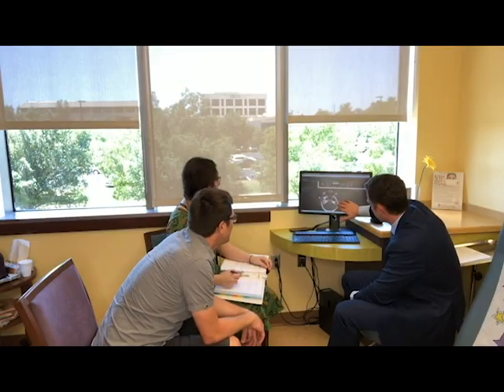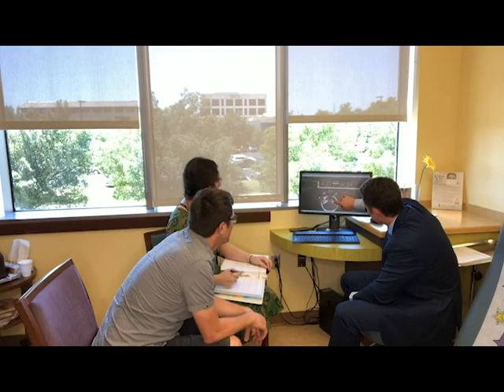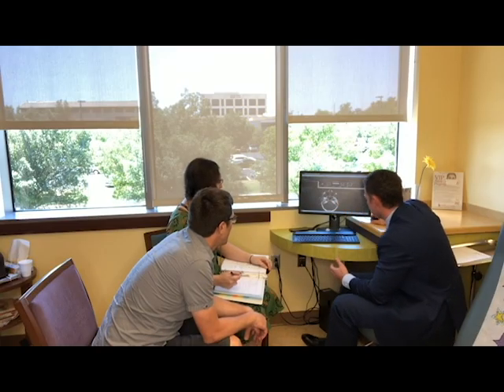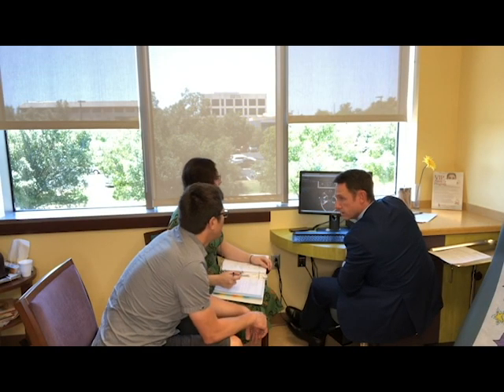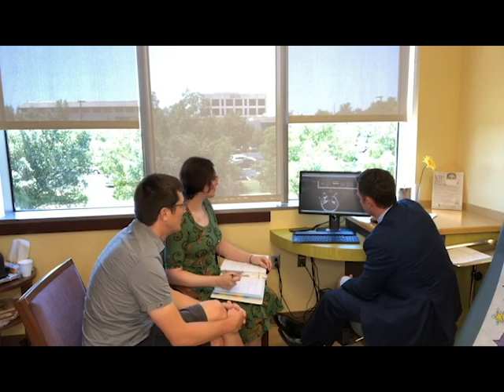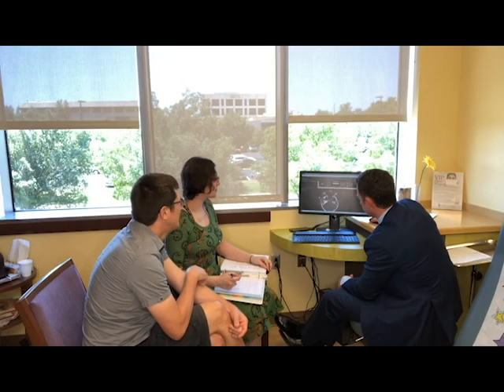This is a pretty common picture. These are your balance canals, your cochlea right here. Your hearing and balance apparatus are here. All this is just air, and you can see, not that it's always a straight mirror image, that some of it has been replaced on this side. That air is a very safe space to work in and drill around, because there's not much there. But we do want to make sure that this is protected. These are the middle ear bones.